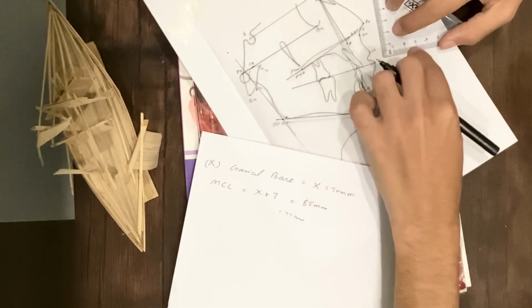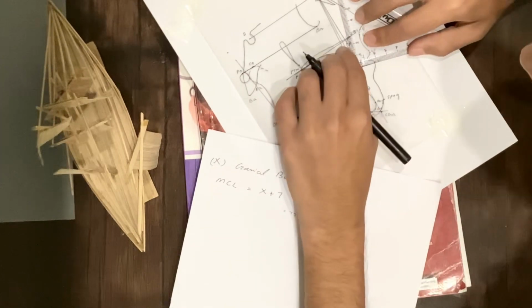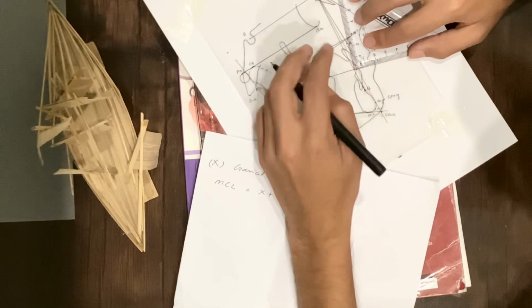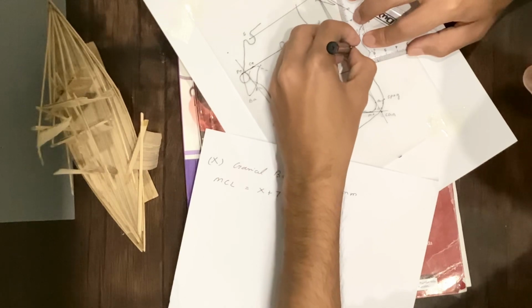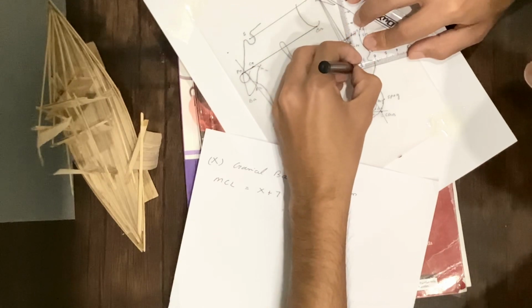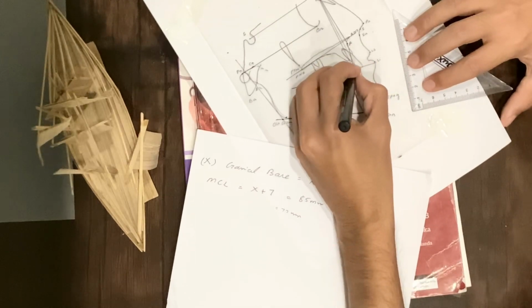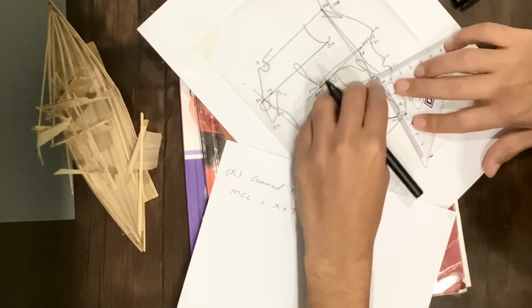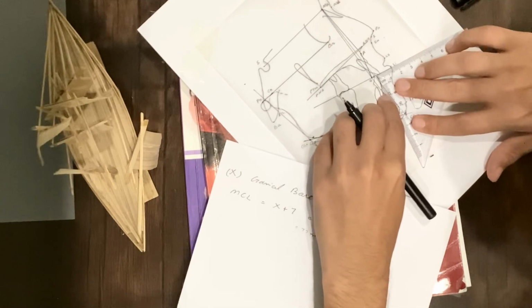This is the right angle of the set square, and we will place it on the functional occlusal plane and meet it with the A point. We will draw the perpendicular line here on the functional occlusal plane. So this is the AO point, and similarly, this is the right angle. We have to place one side on the functional occlusal plane and the other one meeting with the B point.